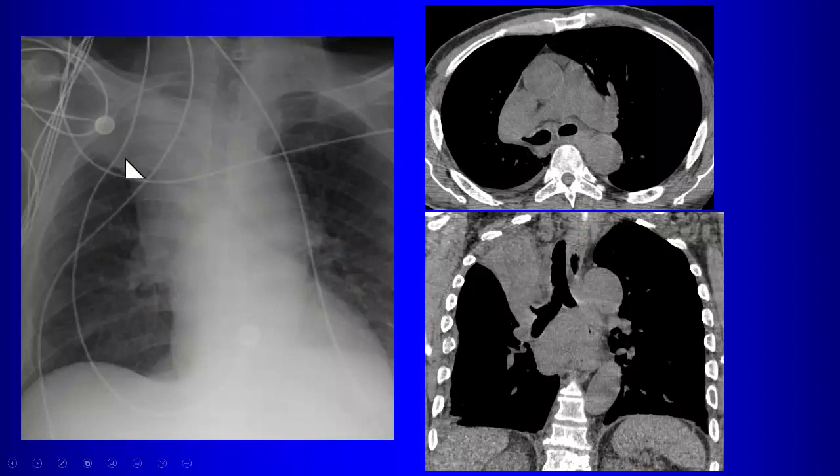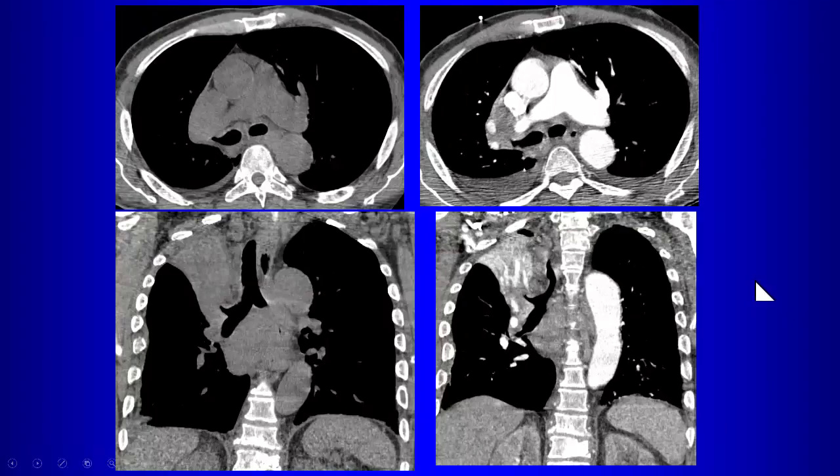Another example, this one is right upper lobe atelectasis, and then here we can see collapse, obstruction of the right upper lobe bronchus, and then just nondescript right upper lobe collapse on the CT. But it's when you give contrast that you can see the difference. So you see the difference here of the hilum, but also here of the lung parenchyma. Notice the collapsed lung is here. These are the vessels. Here is the mass. So the mass, the obstructing tumor, enhances differently than the collapsed lung. So CT with contrast is really helpful whenever you're evaluating cases of atelectasis. Okay.